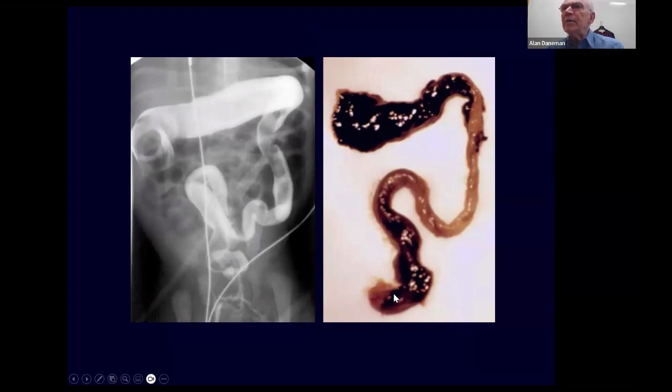After we did the enema, he got rid of this plug. He evacuated this long plug of meconium, which you can see correlates with a small distal colon and a caliber change at the splenic flexure region. And because this is a premature baby, one would not do a biopsy, and one would accept this as a functional immaturity and see how the baby does. And usually they do well once they've got rid of the plug and they start maturing.